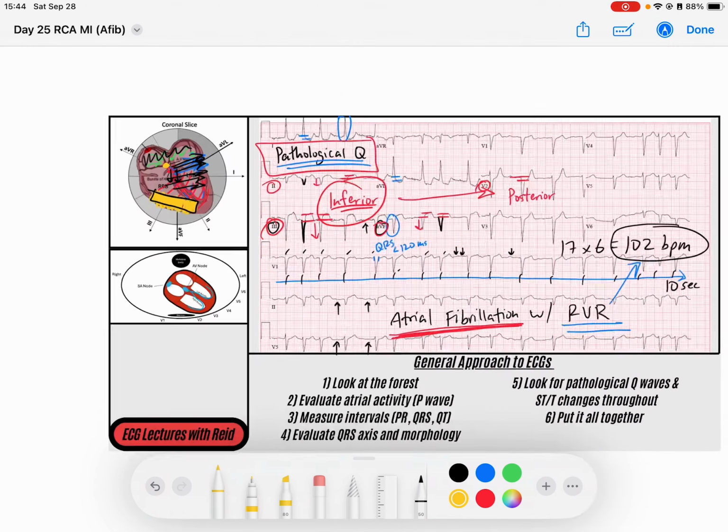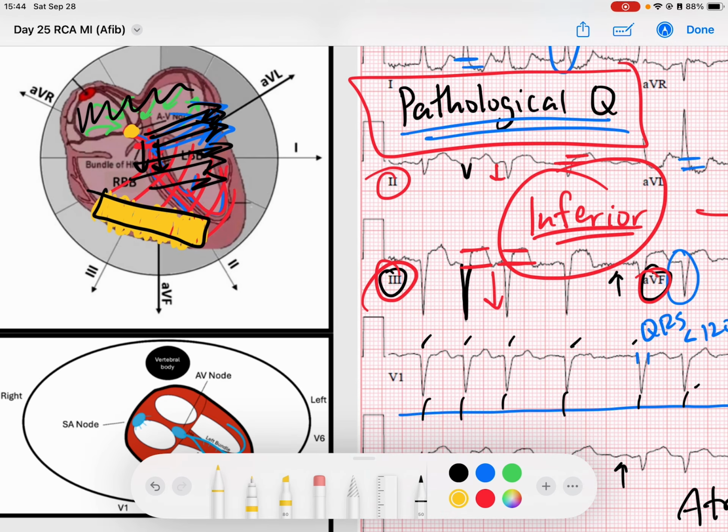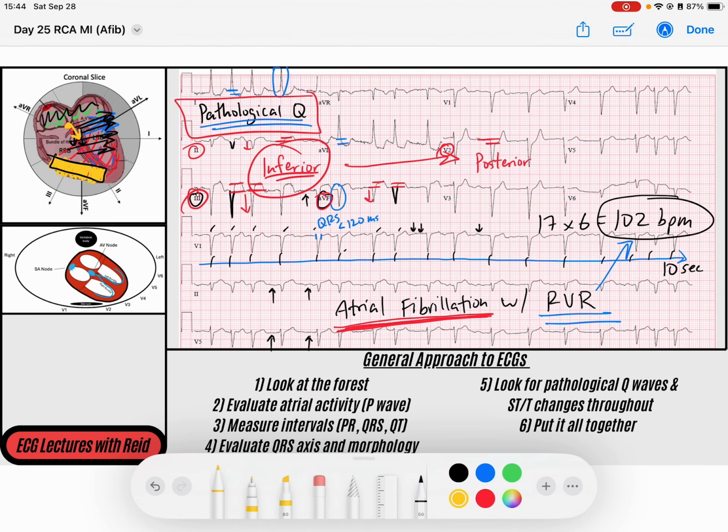And then we know that the QRS complex and those ST segment changes are indicative of what happens inferiorly from my AV node sending signal down. So breaking it down anatomically will help you identify the significance of all these changes and what that means in the clinical setting, so that when you treat your patients, you know what aspect of their anatomy you're treating.